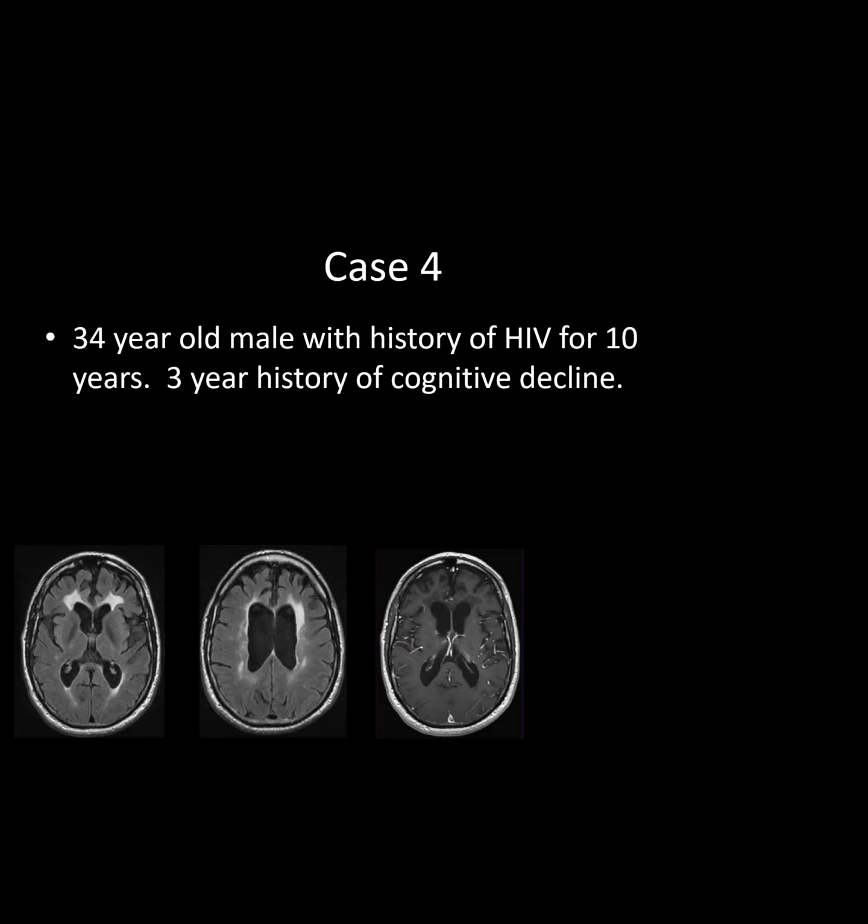We talked about masses in the beginning. I went through some masses on the in-service that I think are important to know. We talked about bleeds and which ones are going to be bright on T1, subacute blood, that kind of thing in different spaces. Now I'm going to talk about a couple of different infections. So just take a look at the question stem and the images and tell me what you see.